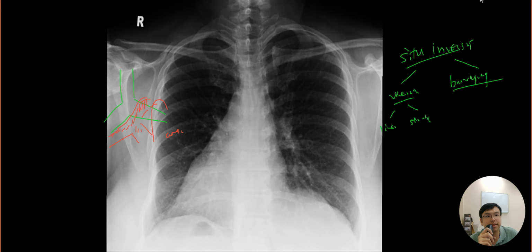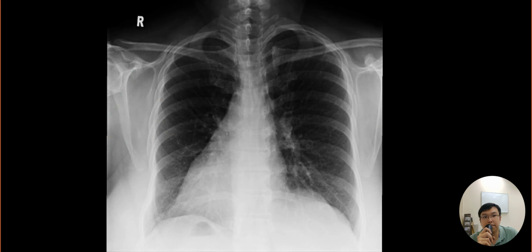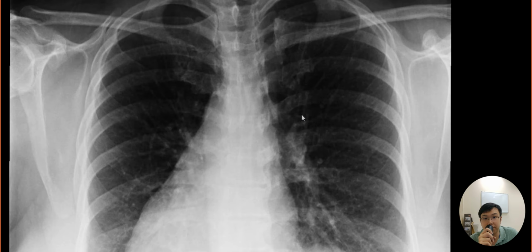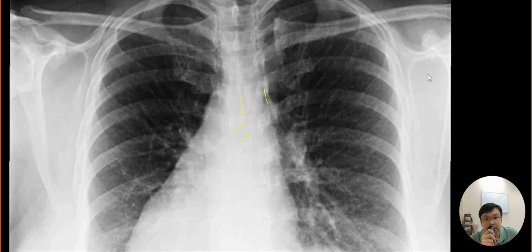So how can we assess that? That's actually a little bit complex, but the easiest way is to have a proper windowing so that we can see the tracheobronchial angle better, okay? So we draw the trachea out, and surely this is the right main stem bronchus, and then we will have the windowing better. Okay, so surely main stem bronchus here and then here.